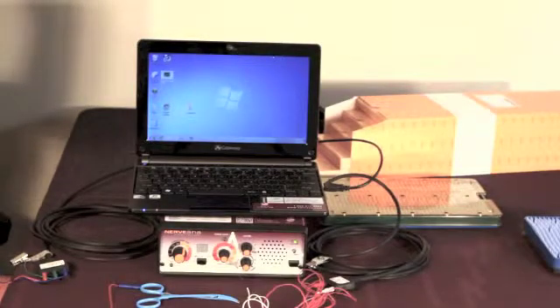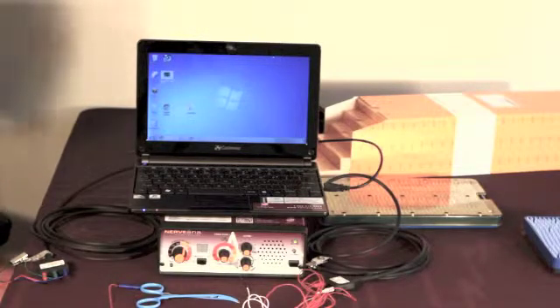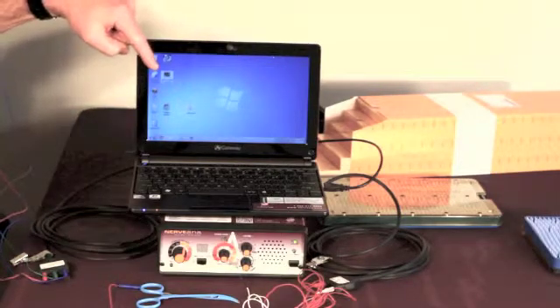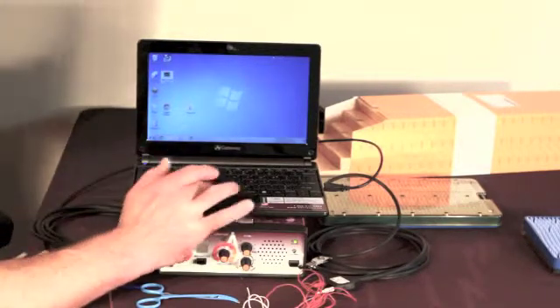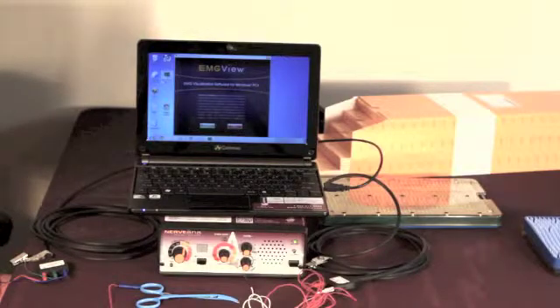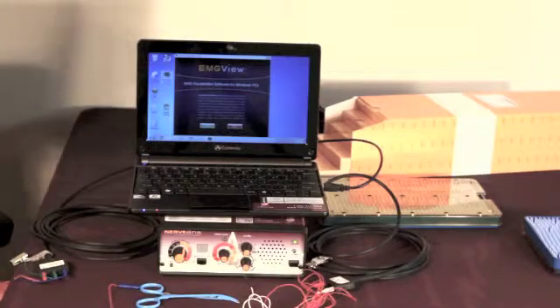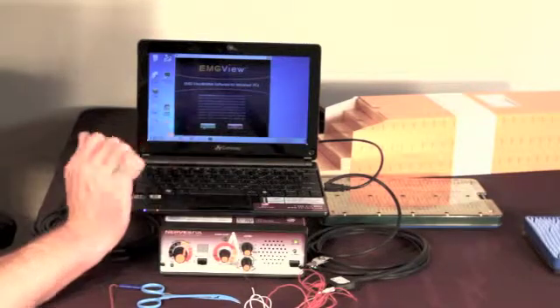Now I'd like to share with you information about EMGView software. It's a software package that was designed specifically for the Nirvana system, and it runs on any Windows PC. Here on the screen we have the Windows desktop and the EMGView icon, which is a little waveform on a monitor. By double-clicking, I launch a screen that has the typical software fine print here, and after reading and accepting, you can hit the green button to run the software.